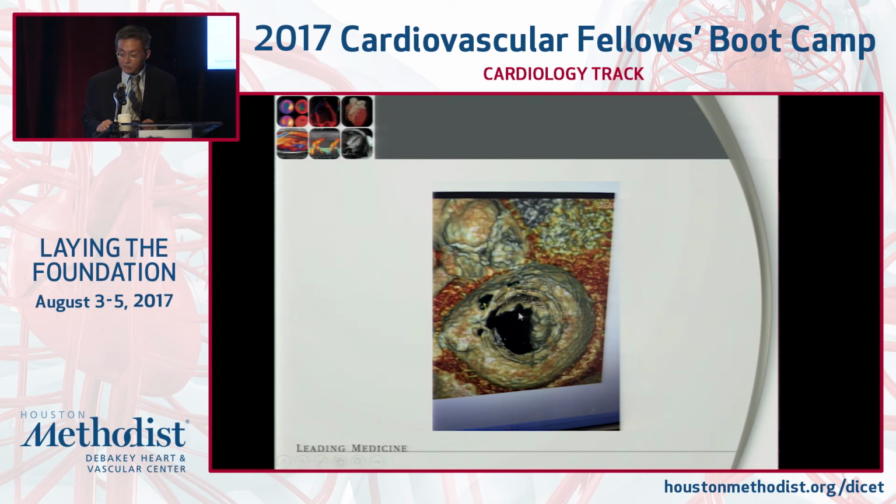So this is the prosthetic valve rendered in 3D, and this is the leak. Okay, and this could be overlaid in the cath lab to facilitate the progressing advance of the catheter and the plug and the wire through the hole for you to deploy the plug.